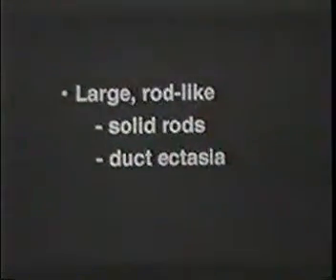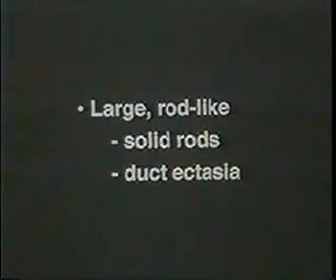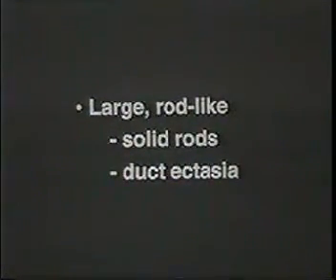In this case, there are also vascular calcifications, parallel tracks, again, typically benign calcifications. There are also large rod-like calcifications that are typically benign.